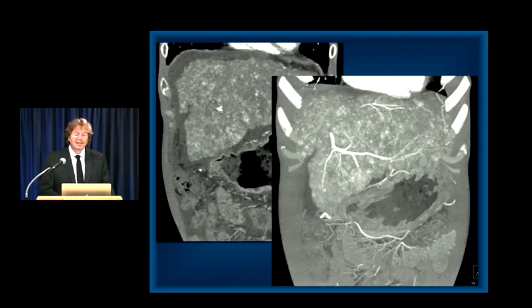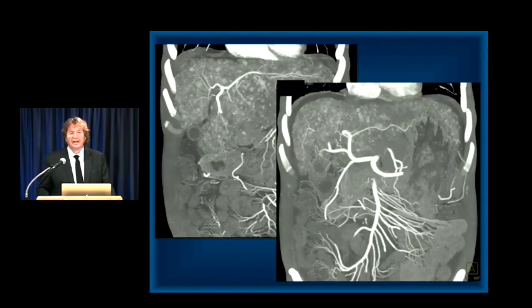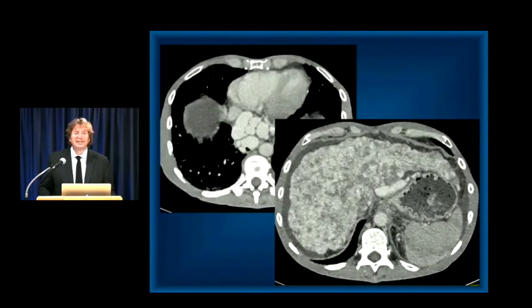You can see the branching of the hepatic artery shown again here, right and left hepatic arteries. The vessels are somewhat stretched, but there's no neovascularity coming off the vessel. And when you're looking at this case, what you're really seeing is a nodular pattern, small regenerating nodules, areas of AV shunting. You can see as you go to venous phase, the large varices, and that mottled appearance to the liver, how the areas of the liver are diffusely changing in terms of appearance.